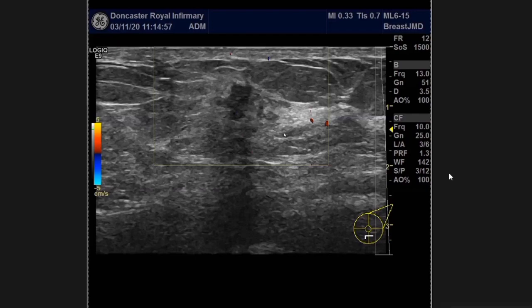It's definitely looking like a malignant lesion, and it's digging deep into the breast parenchyma rather than having a horizontal orientation. There are spiculations, and it's kind of a multilobulated type of lesion. However, on Doppler, I do not appreciate any internal vascularity. Still, it is a highly malignant looking lesion.